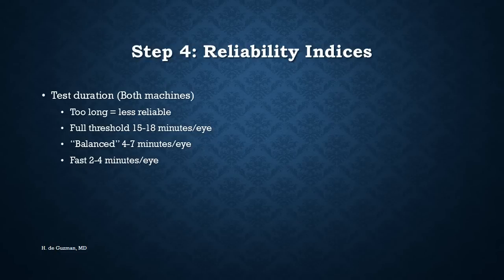Test duration, if it's too long, it's less reliable. Like I said earlier, these are the number of minutes for each eye for the different types of programs or algorithms.